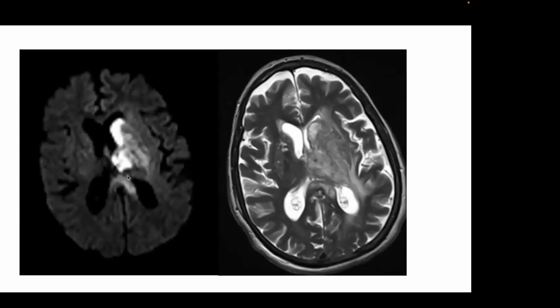I just want to show you this case, this patient. You can see there's this infarct. This is a diffusion weighted scan, and you can see there's abnormal signal here in the corpus callosum, which is unusual. There's involvement here of the caudate and the thalamus, kind of an odd constellation. It looks very tumor-like, but this is the venous injection. Here the catheter is in the internal jugular vein, just inferior to the jugular bulb.